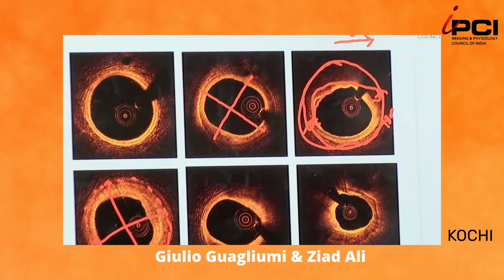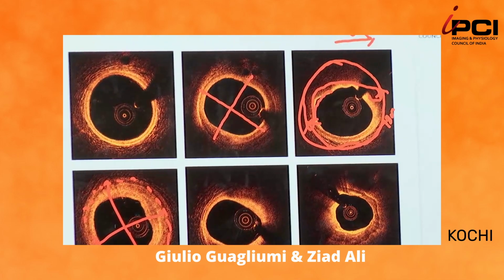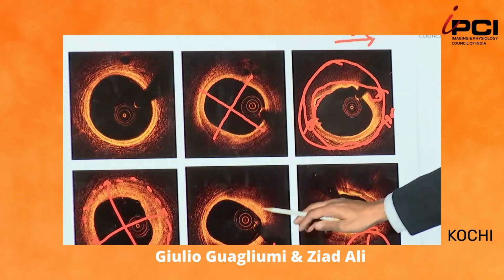Ziad. I think it's critical to understand what the lumen area is, because often our segment where we're going to be using lumen-guided stenting is going to be calcified. If you gave me the choice of this guy or this guy, I'm taking this guy, notwithstanding the lumen. The reason: lipid is like tissue paper on top of toothpaste. If you tear it, the lipid will come out. Tearing this artery is much more difficult than tearing this artery.